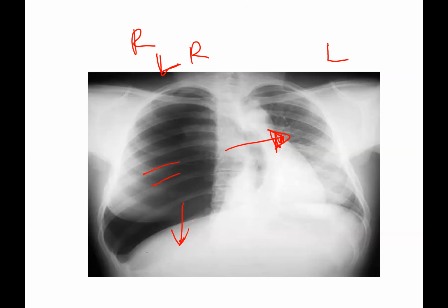Don't you see this diaphragm is lower than the diaphragm here? You see me repeating this again and again. It's something that comes out almost always in the exams. Tension pneumothorax, I've talked about its presentation. Don't forget these three features on an X-ray, okay?